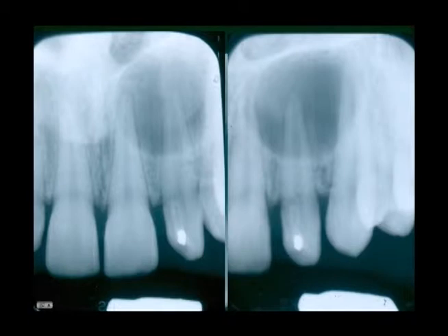However, if you look at the tooth carefully, you can see what is referred to as an invagination. The little radiopaque dip underneath the amalgam likely contains pulp tissue, or did contain pulp tissue at one time. The pulp was exposed in doing this very small restoration. We had a chronic, long-standing inflammation occur, rarefying osteitis at one time.